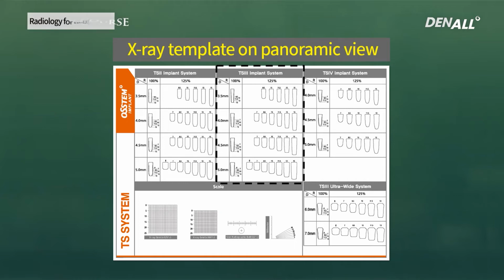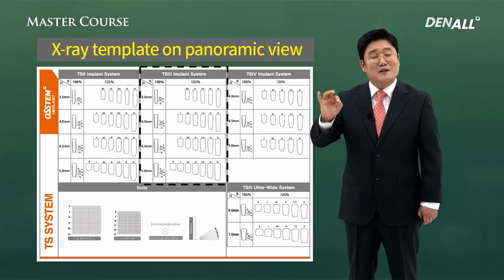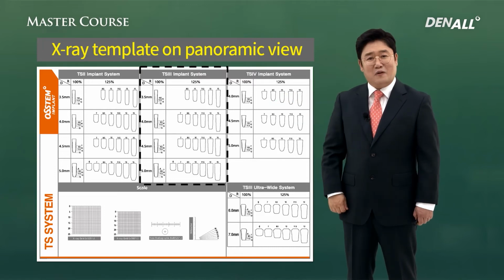The defective region's bone height can be measured, as I said. They are not measured just with a ruler. An X-ray template is used for that purpose. In Korea, the digital trend is very strong today, so bone height can be measured with a program, but still in many other countries, the X-ray template is in use.